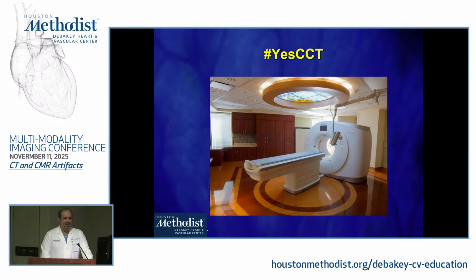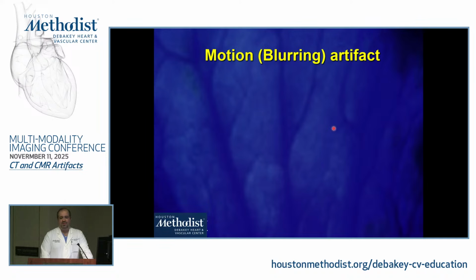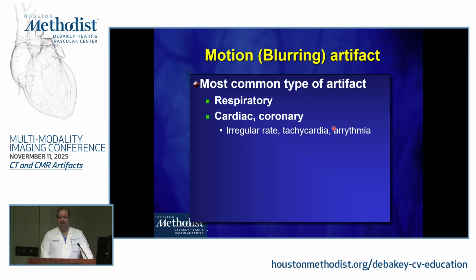So let's talk about cardiac CT and what are some of the artifacts that we are going to see during cardiac CT. It's not about whether you are going to see them or not. The answer is you are going to see those artifacts, and the question is what causes them. Motion artifact is the most common artifact that we see in cardiac CT.